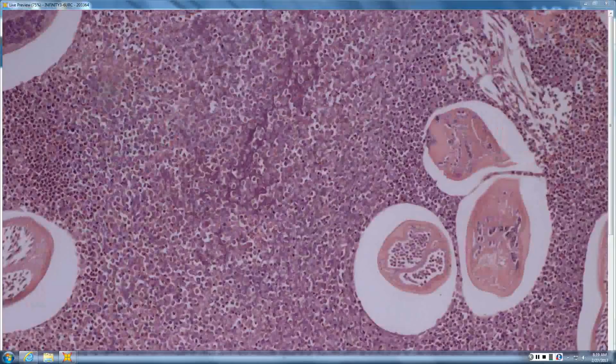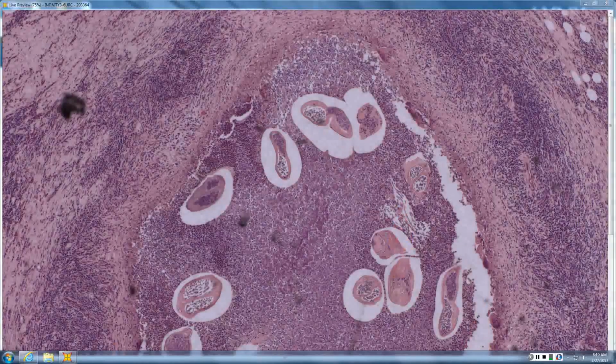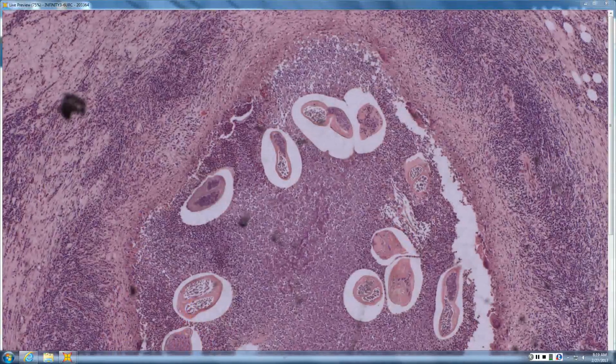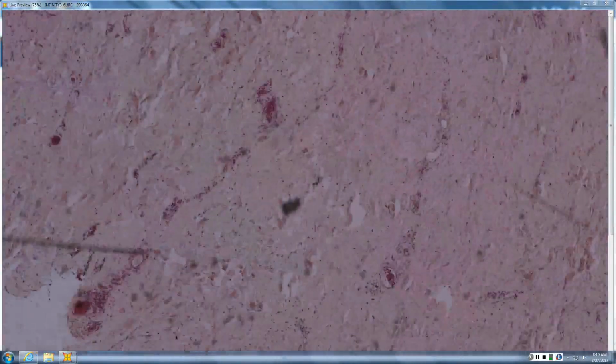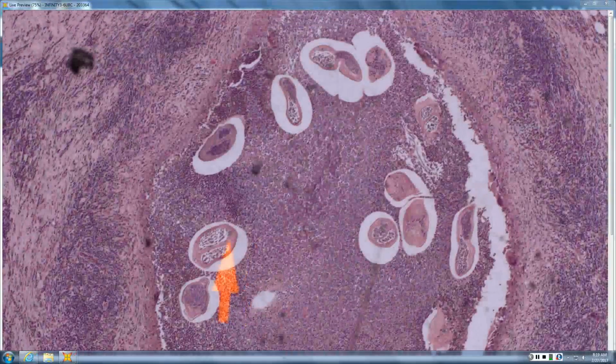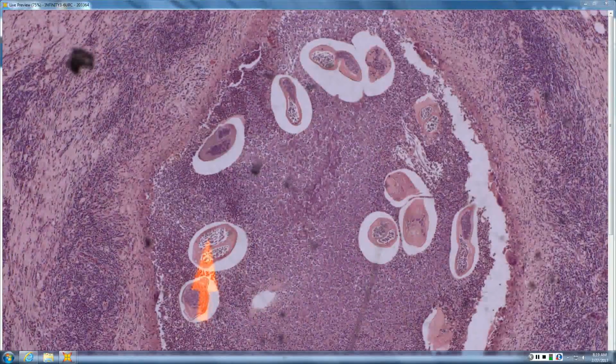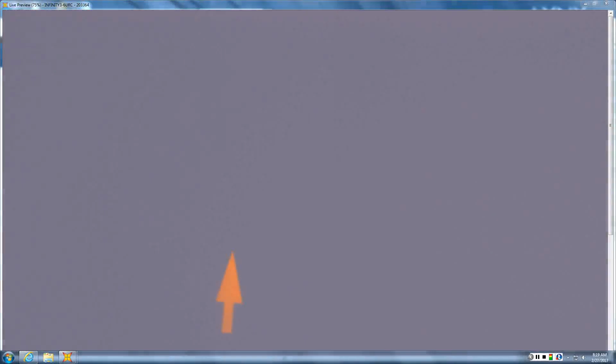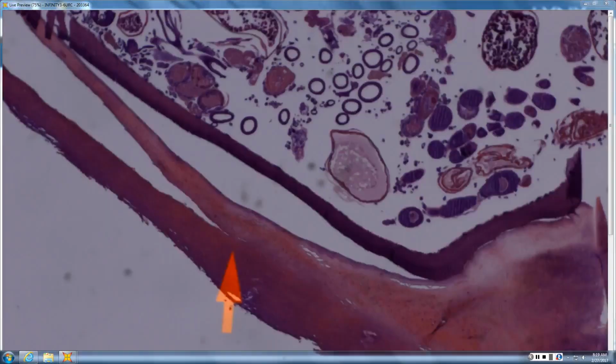Not usually. So, do you know any other kind of filaria-producing worm in this person with very swollen legs? Oh, elephantiasis. Yeah, so you can see the little microfilarial larva in the gut, but the filarial worm itself is the big guy there. So that's Wuchereria bancrofti, which is your usual elephantiasis.